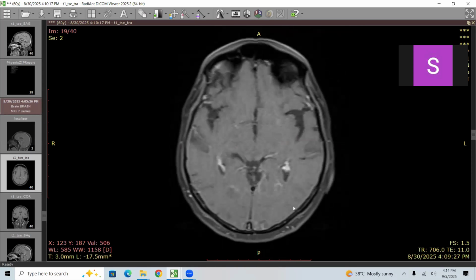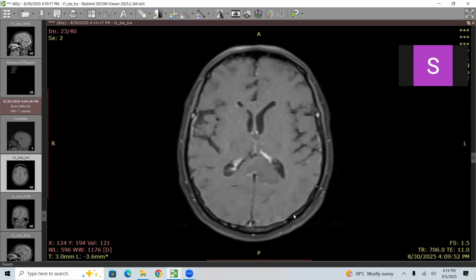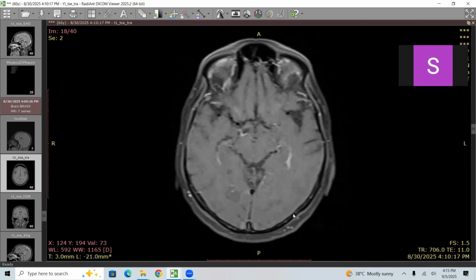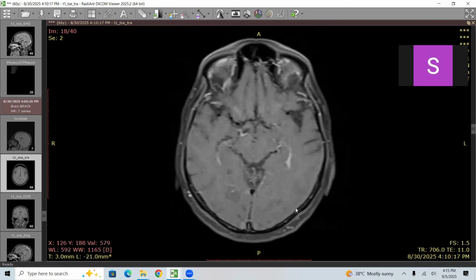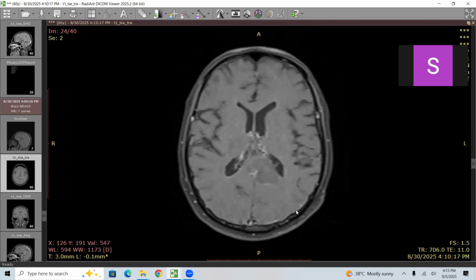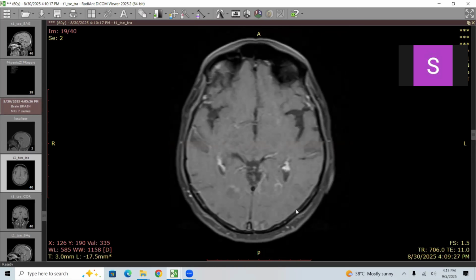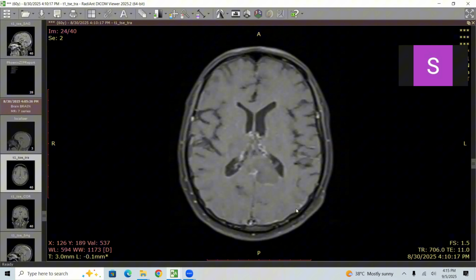Metastasis cannot also be ruled out because it is an elderly patient, but that again would have significant post-contrast enhancement and a lot of vasogenic edema. So can it be multifocal GBM? No. GBM should typically show central necrosis with peripheral thick, irregular, lobulated enhancement.